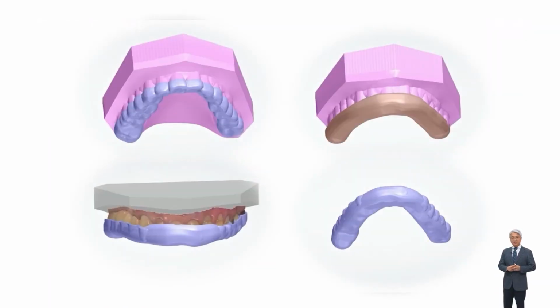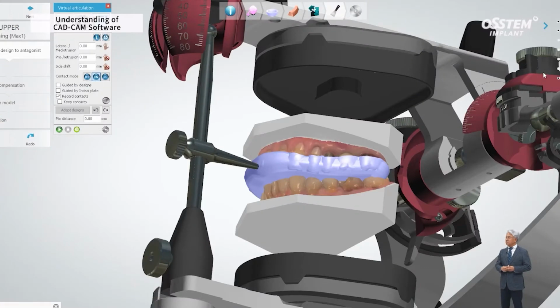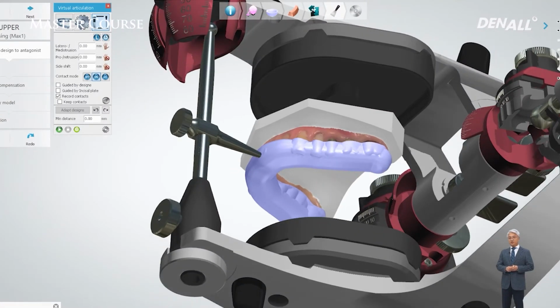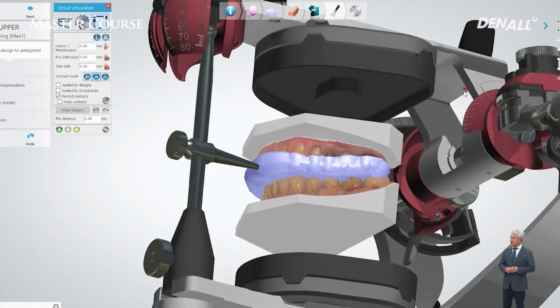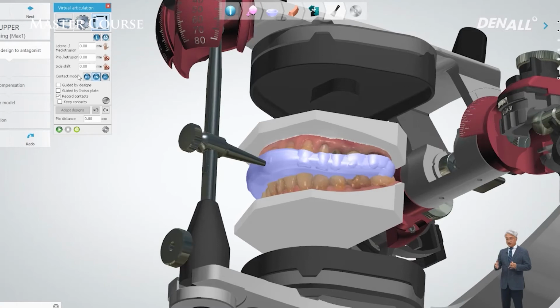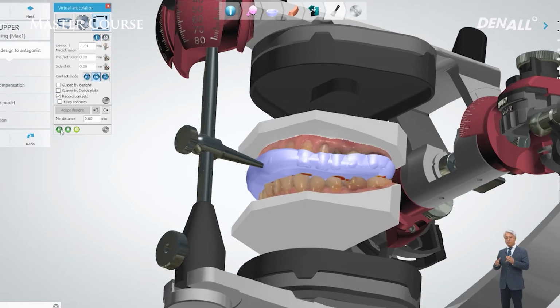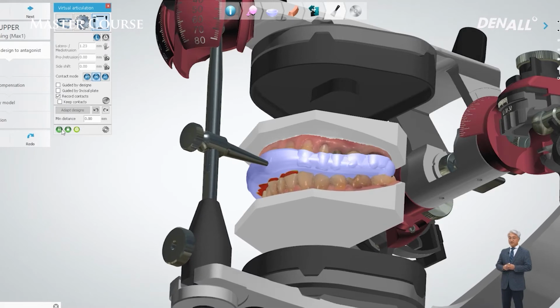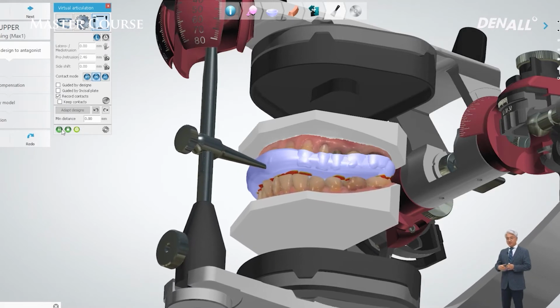In my clinical practice, I use a lot of appliances like CR Splint. When I do this, I want to talk about digital articulator. In CAD-CAM software, the patient's mandibular jaw movement can be scanned and reproduced in the virtual articulator, and you can check the Bennett angle and condyle eminence, as well as incisal angle.